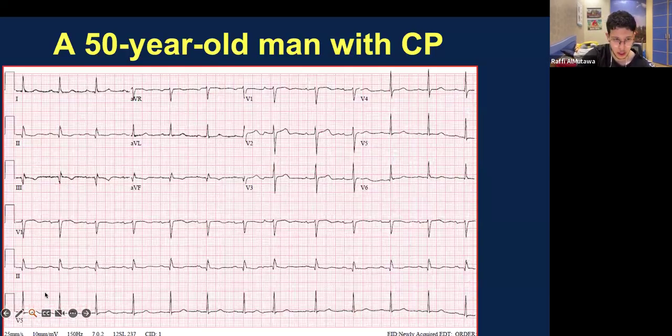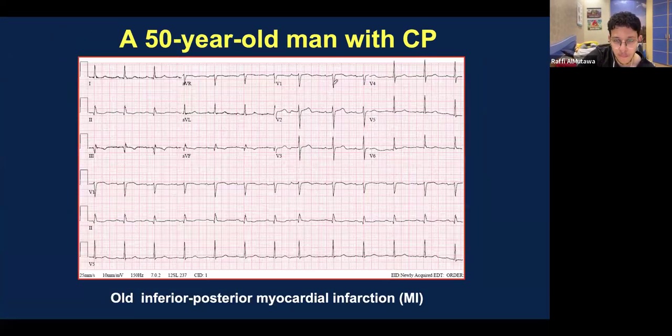Let me show you. If you see, this is the P, the Q is buried, and that small elevation is the R, S, T. P, Q, R, S, T.